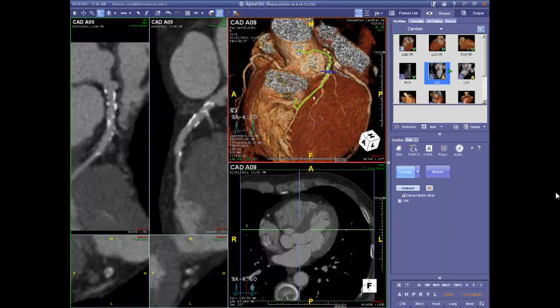I don't really like the center line that's been drawn here because, as this algorithm is run, it sort of dead-ended up into here, part of the right ventricular outflow tract. That's really just seeking in the presence of a little bit of artifact that we can obviously recognize. But the proximal part of this vessel has been nicely rendered. We probably have the distal part of the beginning of this center line originating in the ascending aorta.